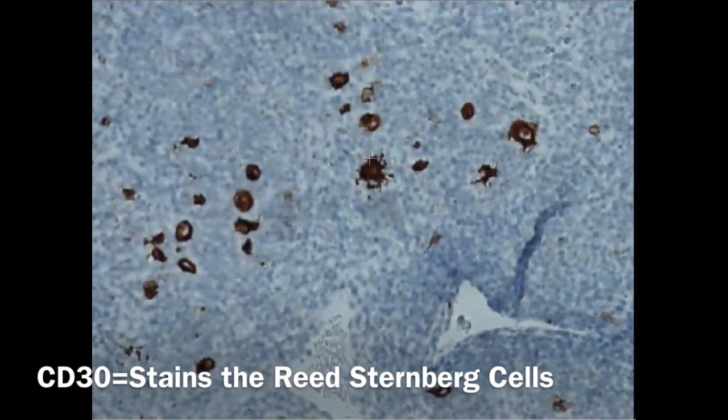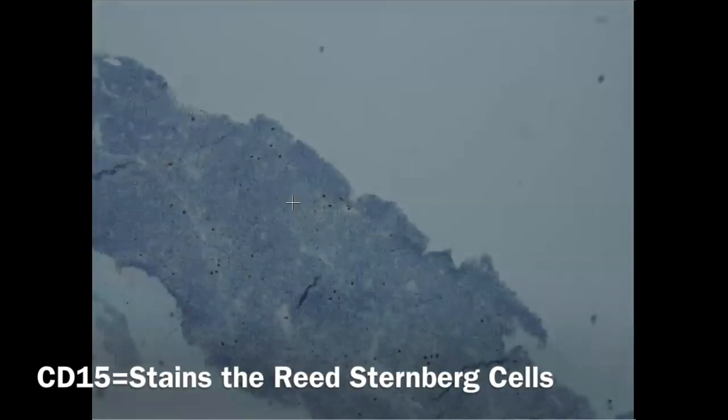So I hope you can appreciate the size of these cells. These are Hodgkin cells. So number one, CD30, and it's positive. I will show you the next stain. It's CD15, and CD15 actually can work. Sometimes it does not work. So the important one is CD30.